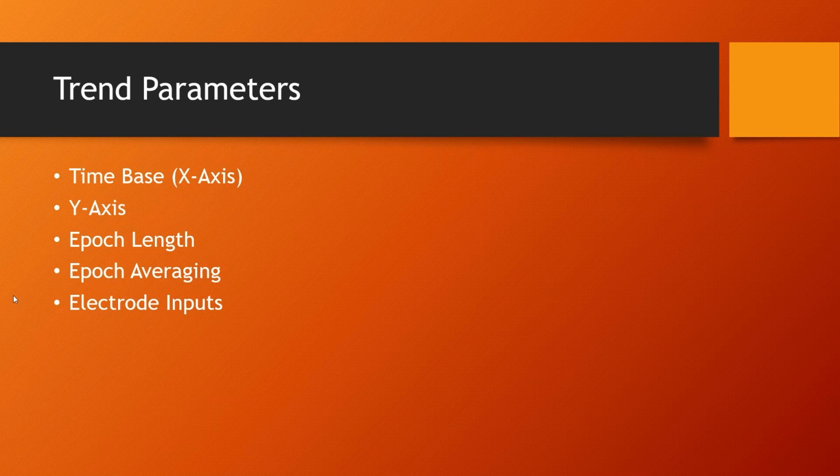Okay, so the trend parameters, Marco? Yes. The question is, the reason is because you will need to take a closer look at the EEG anyways. Right. Oh, absolutely. Yeah, if I don't emphasize this often enough, really the only thing that matters is the raw EEG. So the trends by themselves do not identify what's going on. It's that clinical expertise that you as the expert show in pulling this all together. So trends are just one aspect of this.